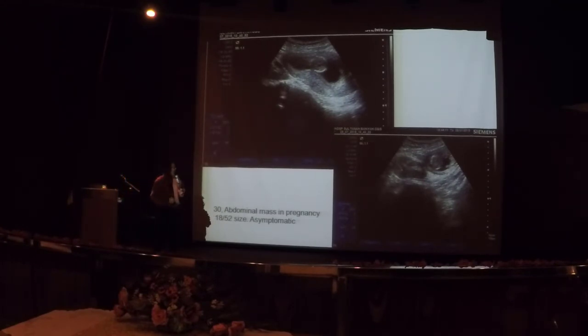So this lady was referred for abdominal mass in pregnancy. So bila you tengok situ, nampak obvious tak? Tak obvious ni. Oh, this one dia tengok. Uterus, nampak pregnancy baby here. And tapi this one is a shadow, tak nampak. Not obvious. So nampak apa?